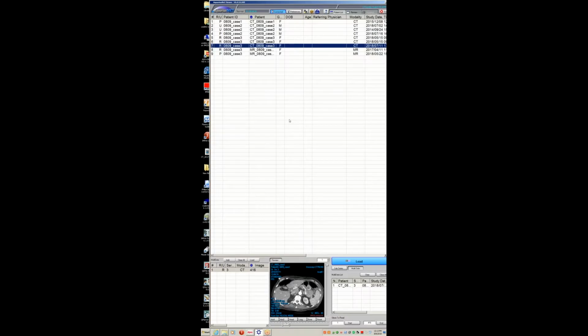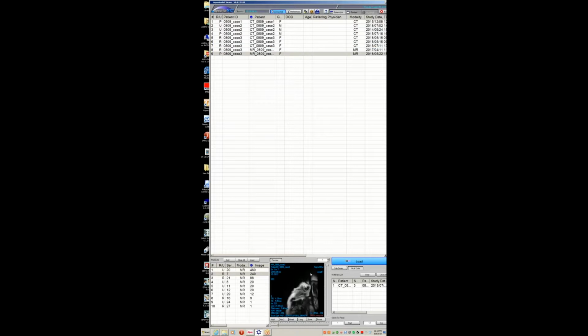And I've heard of case reports of B-cell lymphoma mimicking hypertrophic cardiomyopathy. In this case, it kind of does, I mean, there are other things to tell you, but the morphology and the delayed enhancement kind of do look like it, but all the other stuff is wrong. So that's just another case. But wow. That's what I got.